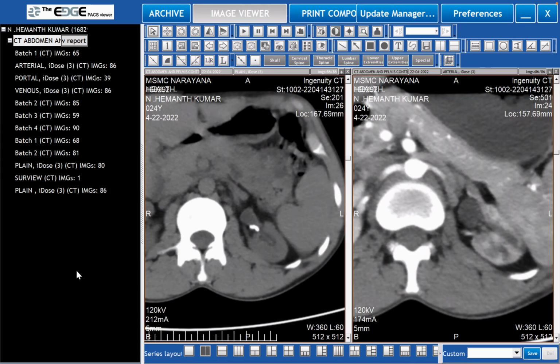In this cut, we can see the same multiple hypodense lesions, along with the pelvis is extrarenal and dilated, and the renal artery caliber of the left side is less as compared to the right side, and perinephric stranding can be seen, sir, in the interpolar region of the left kidney, along with reduced parenchymal thickness, sir. Show some more cuts.